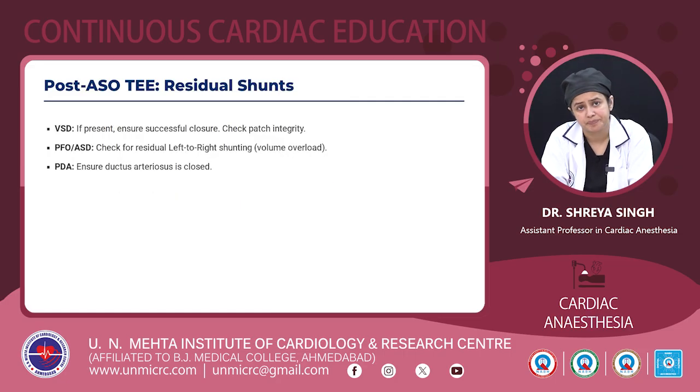revision. We look for any residual shunts, VSD if present, it ensures successful closure. We look for patch integrity. PFO or ASD is seen, and we look for any residual left to right shunting because it could lead to volume overload later on, and we ensure that the ductus arteriosus is closed.